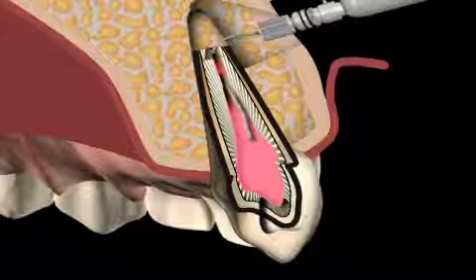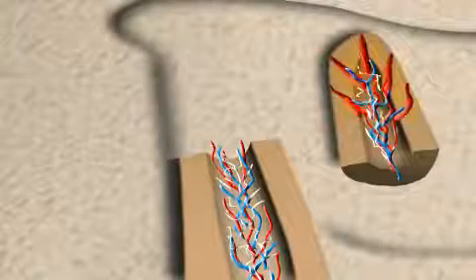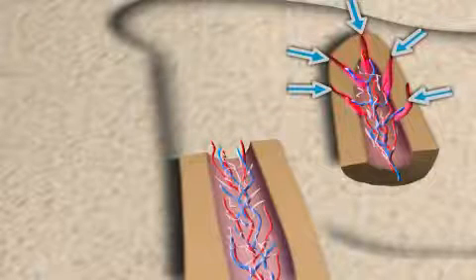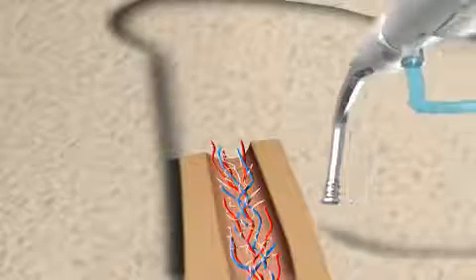By cutting the root tip, all non-refillable side canals, seen blinking here, are removed. The root tip itself often branches out into several single canals, and therefore has only one cleanly filled main canal remaining. The inflammation origin is also removed.